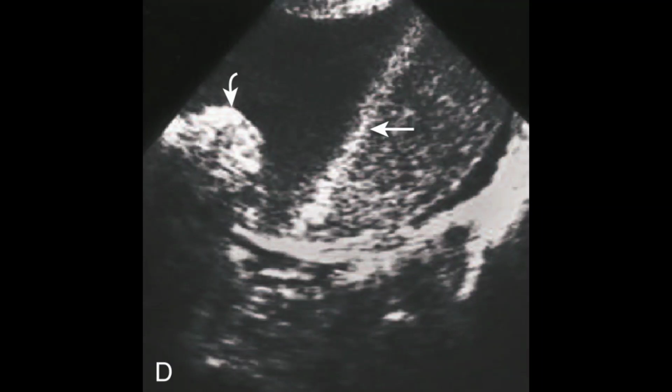On the left side you can appreciate a fat containing dermoid plug, which is characteristic of dermoid lesion. So I'm sure you will not miss it if you come across a lesion having both reticular pattern and dermoid plug. Sometimes you may see only one appearance. Maybe the reticular pattern would be visible, or maybe you may be able to see only the dermoid plug. Whatever the case, this is dermoid appearance.